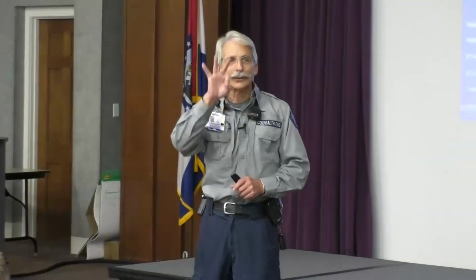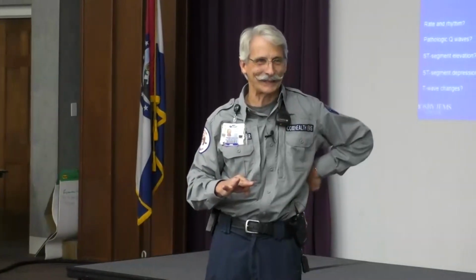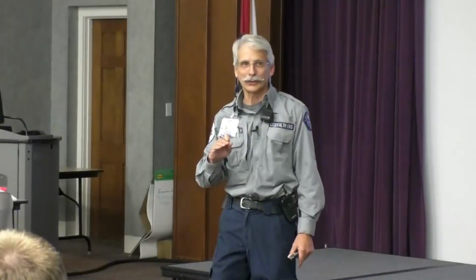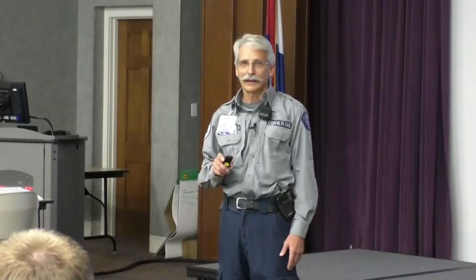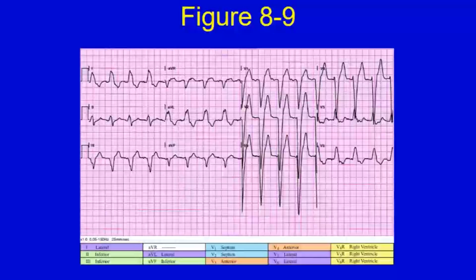Okay? 3 little boxes, 0.120 or 120 milliseconds. Boy, don't you love the decimal system? Or metric system, I should say. So this is wide enough.